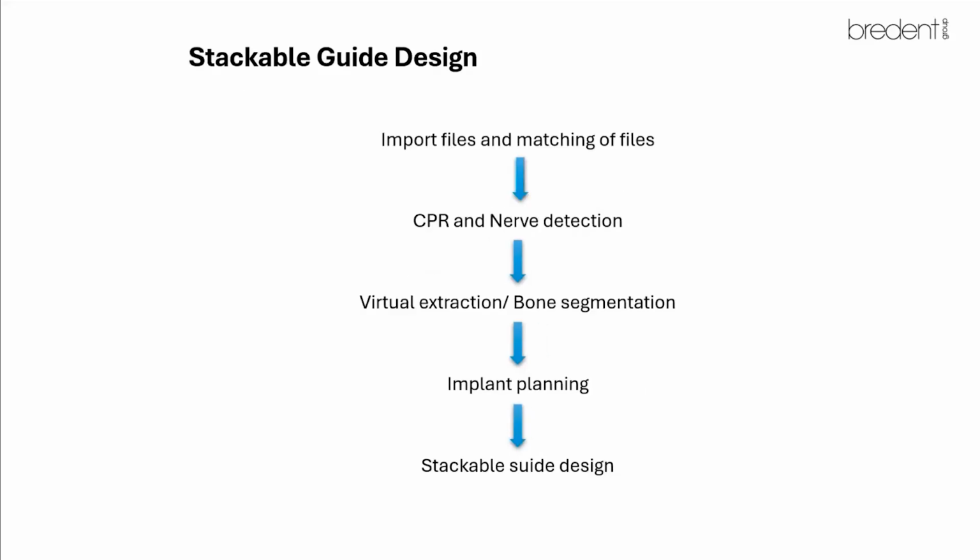Now the next step is stackable guide design. So here you have to listen more carefully. The steps feel a little complex, but once you start practicing and make at least 3 or 4 designs, it will be very easy for you to remember and understand. So I expect a little more concentration when I'm going through this procedure. In the beginning, it might look complex, but it's not so complex.